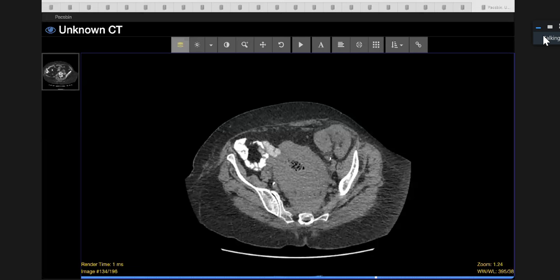But that explains why they have cysts in the liver then, because someone put that in the chat box. They said, oh, liver mets. Well, no, it's not actually, because you'll know that in polycystic kidney disease, it's not just the kidneys that are affected.